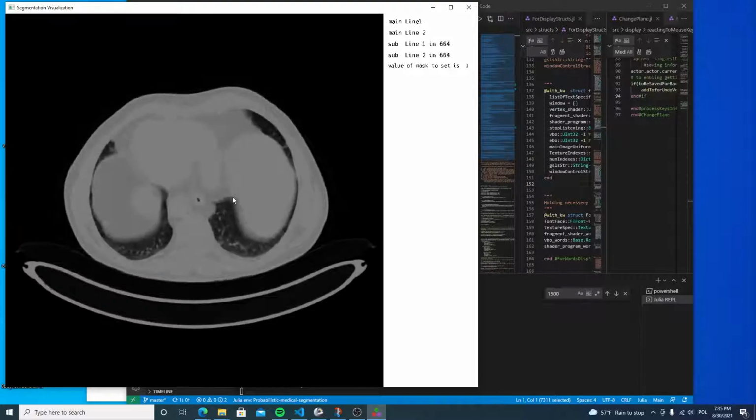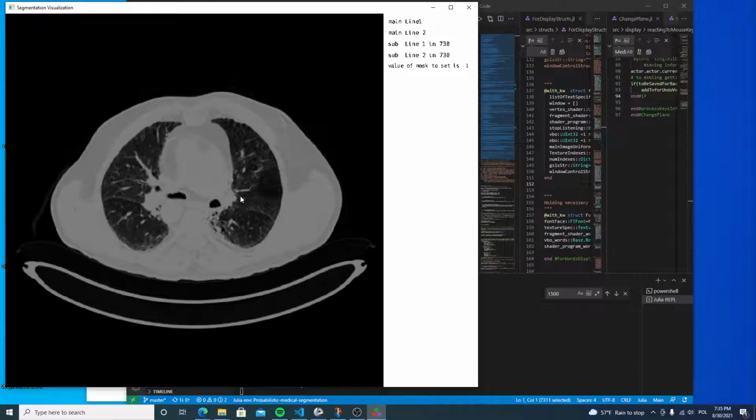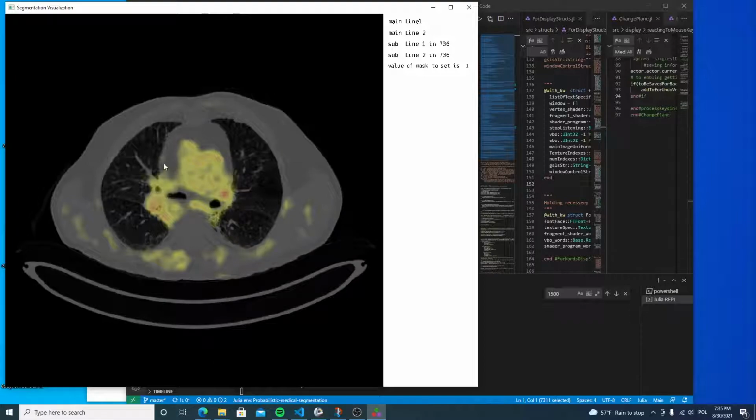There is also a possibility of subtraction of two masks. In order to show this, I need PET data also, for example. In this case, it's not the perfect dataset to show this, but we will see. So, for example, in order to make a difference between mask 1, so PET, and 2, so the manual modification, or between manual modifications and PET, we can, for example, press Shift 2 M1.